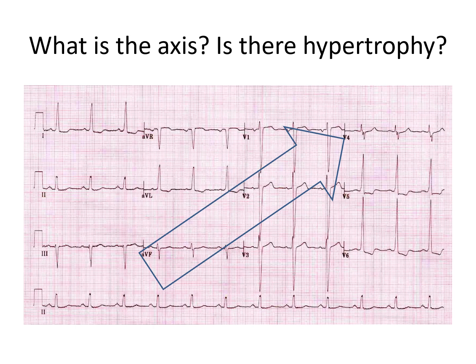And finally, if the combination of the upwards deflections in V5 or V6 and downwards deflection in V1 or V2 are more than 7 squares or 35 millimeters. And if you look carefully, you'll see that actually all of these criteria are fulfilled in this particular EKG.